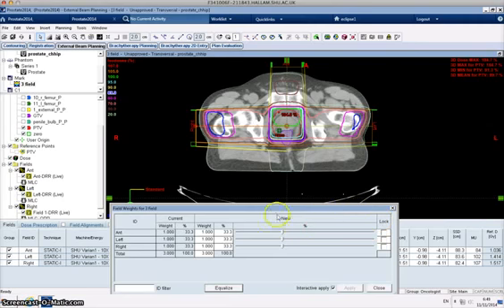If you've got several fields, so 4 fields or more, you might want to adjust. Even with 3 fields, what we could do is lock the ant, for instance, and that allows us just to change the lateral. We might want to do that to balance things out later on as well. If you've got more than 3 fields, you can lock more than 1 field at a time to do that. So let's click equalize again.